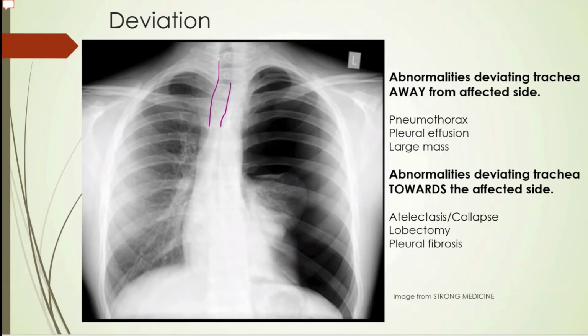In this patient here, you can see they have a tension pneumothorax. Let's go through the systematic approach here. So we did A. We see that the trachea is deviated somewhat. Looks like that's probably the carina right there. B, look at the bones. They're all fine. C, cardiac silhouette. And you can see the silhouette here is pulled or pushed towards the patient's right-hand side. D for diaphragms. The diaphragms are here. A little bit of a poor x-ray because it cut off the bottom margins there.